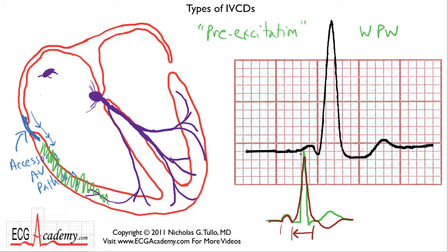So here, this EKG is a typical example of pre-excitation. If you measure back from here, you can see the PR interval is short. It's only maybe 100 milliseconds. The QRS complex is wide. It's just over 120, about 130 milliseconds here. And the upstroke is somewhat slurred. See, it's not a sharp, rapid change in voltage over time. It's a very slurred upstroke.